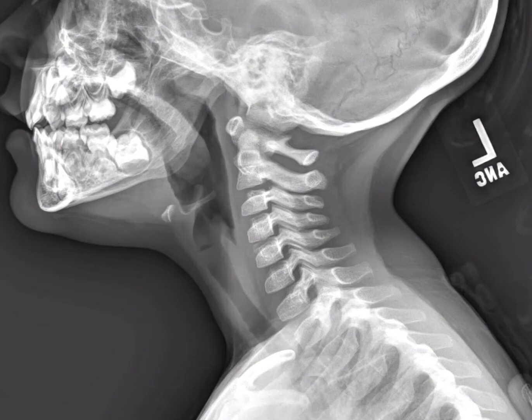seen right here. One common entity we can diagnose on our lateral neck radiograph is epiglottitis. Here with our normal epiglottis, we see nice crisp margins, and we can see the aryepiglottic folds coming down posteriorly and inferiorly with slight posterior concavity going down to their bases. With epiglottitis, we get abnormal thickening and opacification of the epiglottis, forming the thumb sign. Also, the aryepiglottic folds, instead of going down with this slight posterior concavity, go more straight or can even be convex posteriorly. Also, you can get pharyngeal overdistension.